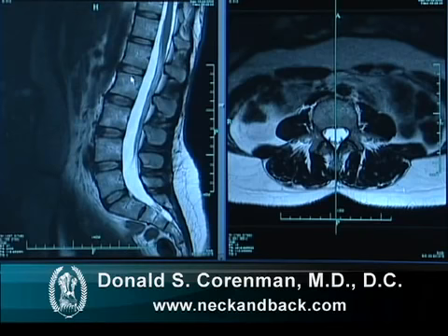The vertebrae themselves have a normal grayish hue, which is a little indeterminate. That's what bone looks like, which is filled with osseous structures and with fat. The edges of the bone on the sides, you'll see these little black and white areas. These are where the veins of the bone exit, called the basivertebral veins, and they're normal. If we follow back here, we can see the spinous processes of the vertebra in the very back, and in between we see both muscle and ligament that hold these vertebral processes together.